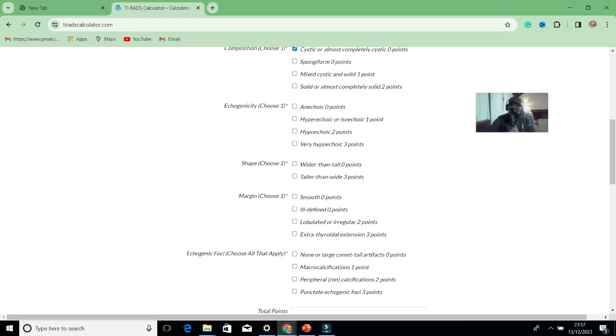Then you come again here. In terms of the echogenicity, you see anechoic, hyperechoic or isoechoic, hypoechoic, very hypoechoic. Let's say that the lesion you are dealing with is anechoic, then you tick here.